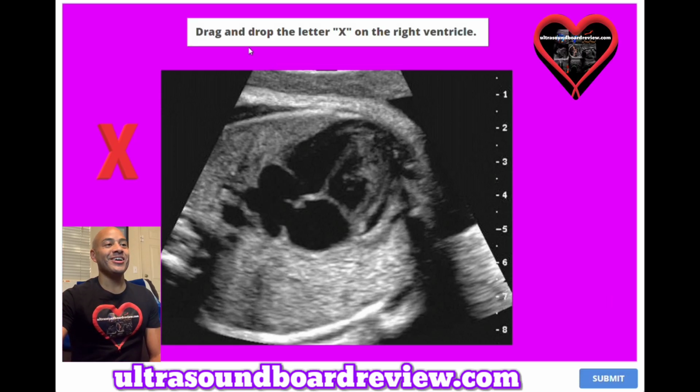Question number 12. Drag and drop the letter X on the right ventricle. So where would you put this X on your image? Remember from the previous question, how do you locate the right ventricle?